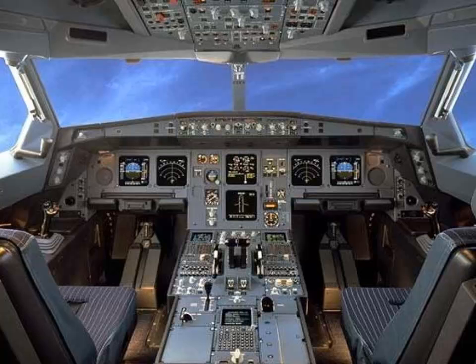But like flying a plane, being unfamiliar with the technology can cause a lot of stress. However, after this session, ultrasound physics, transducer manipulation, and image adjustment will come second nature to the operator, just like flying a plane, or riding a bike if you prefer.